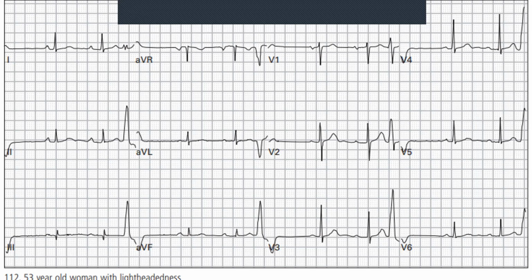Do you understand how you get to that point? Okay. Shame, Doc, you're looking scared. All right. So let's say you did have a P wave inside here. So you had a P wave that came out of nowhere, and then you had this. You could say that that was maybe a premature atrial contraction. No, not really, but technically speaking, you would be correct. But because there's no P wave, in other words, the atrium is not contracting, the ventricle is just contracting on its own. So it's an ectopic ventricular contraction or premature ventricular contraction.